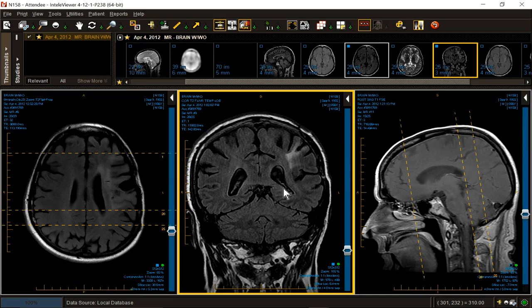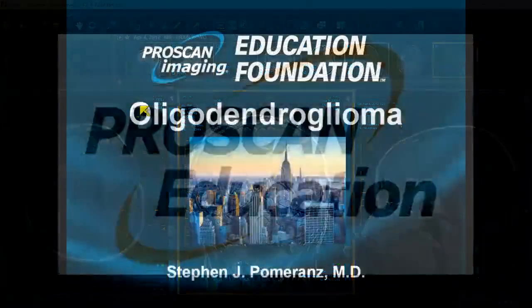Rule of thumb: biopsy, oligodendroglioma; genetics, oligodendroglioma. Every single abnormality on the FLAIR, in my experience, is oligodendroglioma, whether it enhances or not. The most aggressive parts are the ones that enhance. But the entirety of the white matter signal change is oligo. Now let's talk about oligodendroglioma didactically.